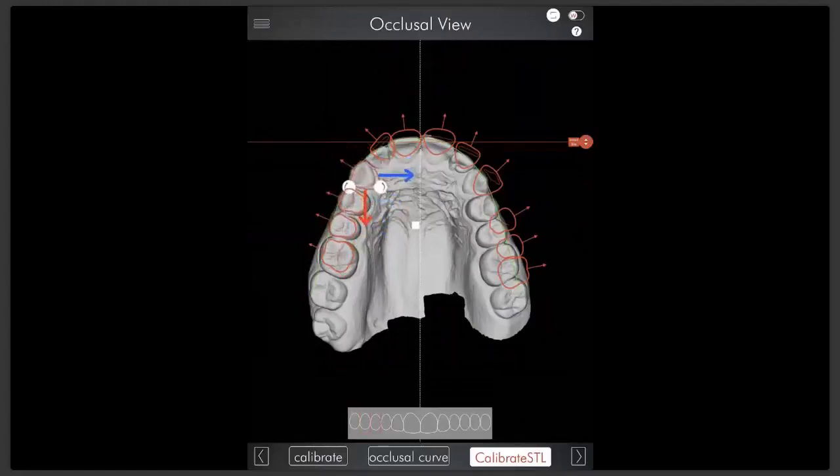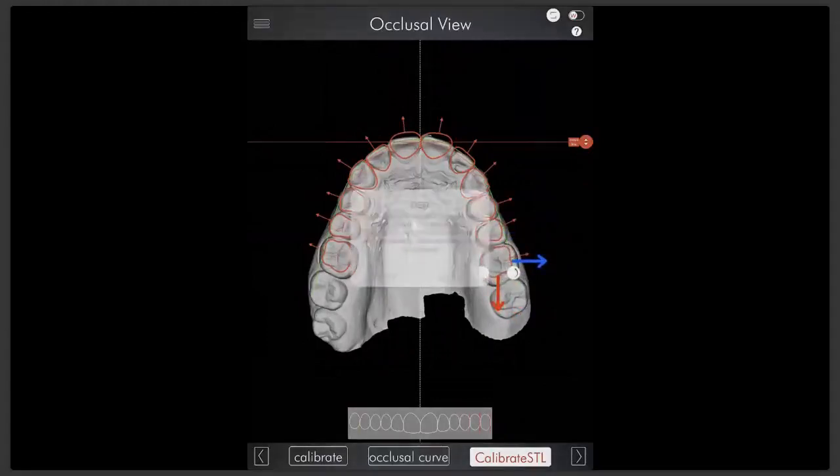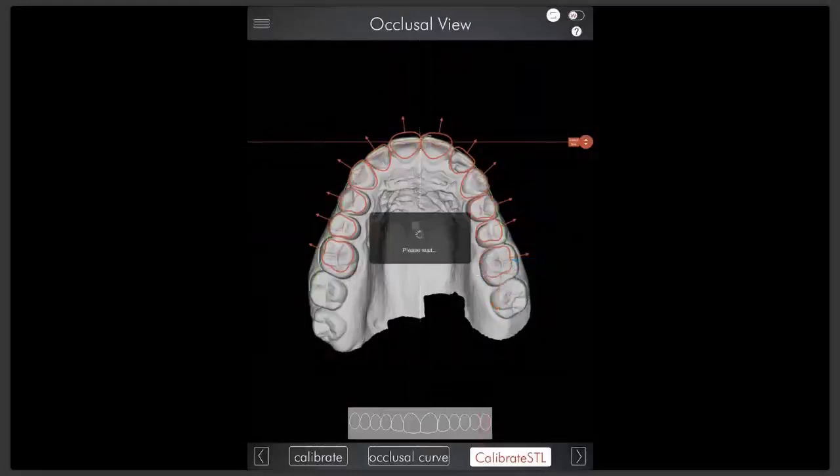So basically here I am calibrating the new shapes of the design. This is just a first reference. I like to start, there's no rule, like here on the side there is a little bit more to the back. I'm going to go with the centrals. Always hold on the arrow, otherwise it's not going to move. Second premolar as well. There we go. Move forward, click proceed, and now it's going to take us to the smile frame.